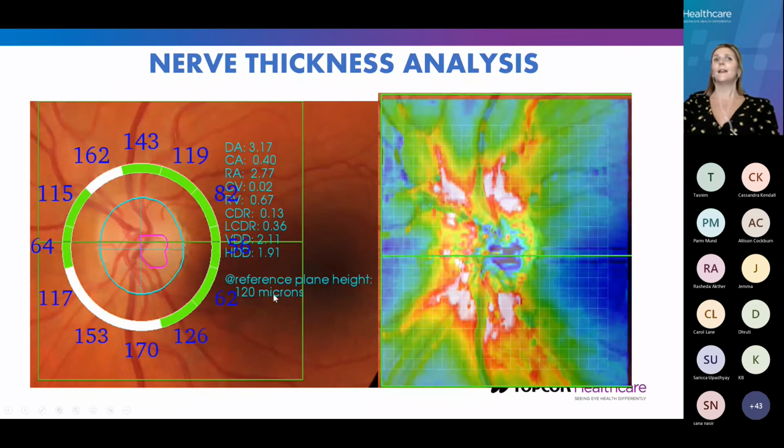If we see thickening of our optic nerve, again, we know we don't grow retinal nerve fibre layer. So we've got to be very aware of what's going on with that patient. Again, the histories, is there anything abnormal that you're concerned about when you're looking at the physiological sort of image of that fundus photo with the disc? Is there anything sort of pulling out on the infrared or the red-free image? All of those really help you to build up the analysis.